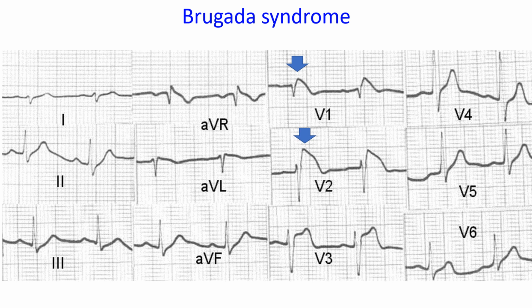Another ECG abnormality which can cause heart rhythm abnormality is Brugada syndrome. In Brugada syndrome, there is ST segment elevation in leads V1 to V3 which may mimic a STEMI. There is also an R prime wave resembling right bundle branch block pattern. Brugada syndrome can lead on to life-threatening heart rhythm abnormalities.